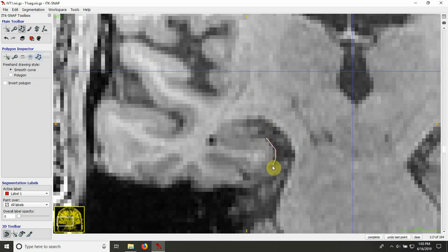So if you outline the cortex, that's around here. So I use that border, but that's a border that's different between protocols. And then I'm including this portion here, which is actually the fimbria. And I'm also, of course, have been including the alveus. And those are things that I would personally do on T1-weighted MRI, but not necessarily on T2-weighted MRI.